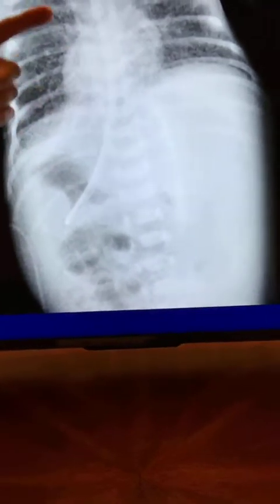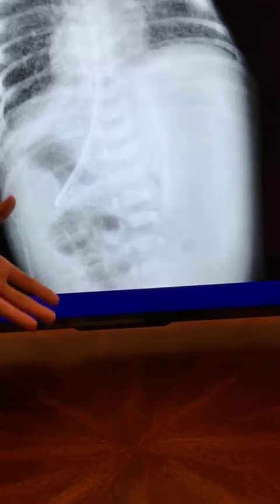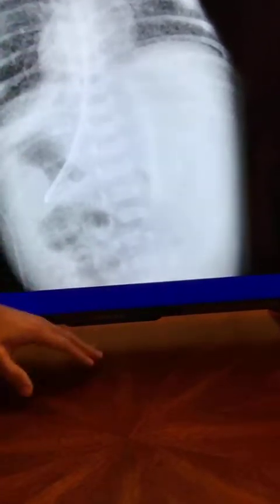But I did say the only time that it'll go from way up here to way down there will be on a baby, because the x-ray plate is actually big enough to accommodate the baby. So this was in a babygram, or just a crazy large x-ray that covered the chest and the abdomen. So that's what I put up secondarily on today's Case of the Day Part 2.